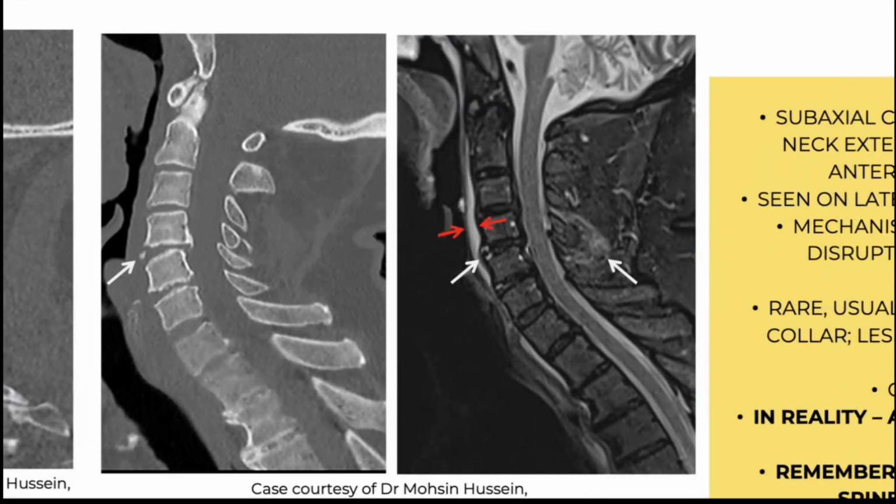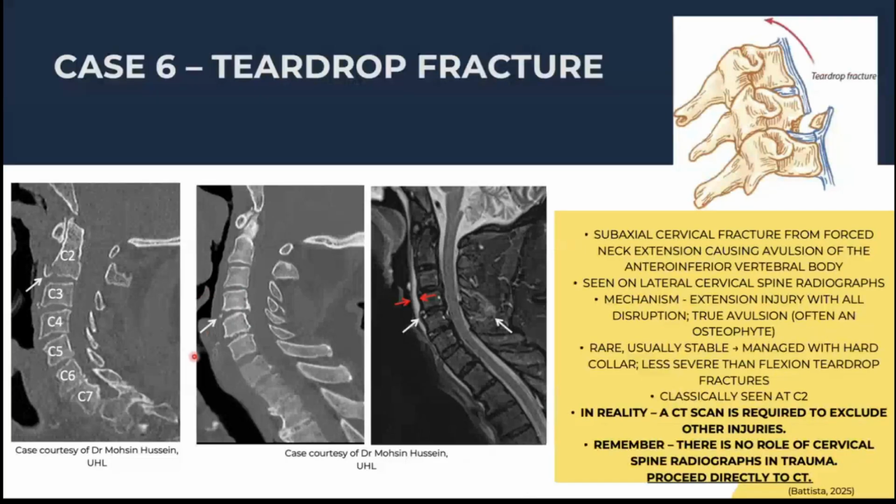And if you had a radiograph, you might struggle a bit more with this one, because you can often get small corticated osteophytes in the anterior corners of the cervical vertebral bodies, and they're of no significance really. They're just degenerative. But with the CT, you can actually see that this small piece of bone fits quite nicely into that anterior inferior corner of the C4 vertebral body. And if you look, there is possibly some subtle posterior subluxation of that C4 vertebral body on the one below, ever so slightly. It's come back ever so slightly. So we're glad we did the CT in this case.